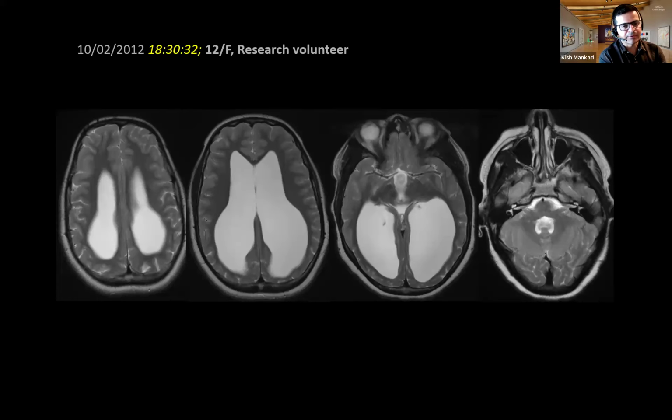So these Latin derived terms or Greek derived terms have actually lost a lot of significance when practically approaching the problem. There is ventriculomegaly, and there is a reduction of the white matter in the brain, particularly posteriorly, as you can see. And maybe this was the context of something like an arrested hydrocephalus in early life. But the brain has undergone a lot of rewiring, as you can see. And the child is really doing very well at school. It's a true story. And she wanted to become a lawyer and all that. Now, not that I say that lawyers need to have big ventricles to start with, but there was no concern.